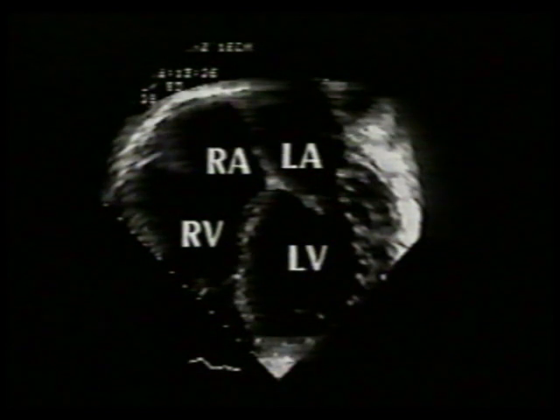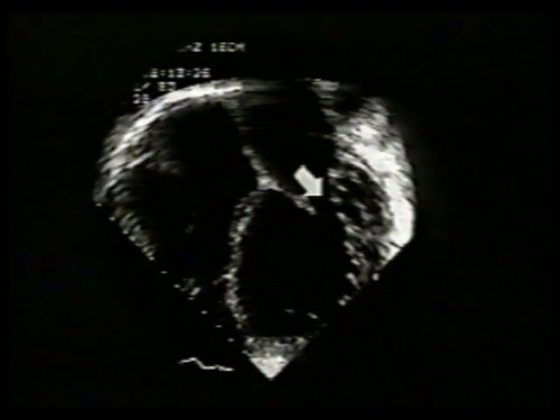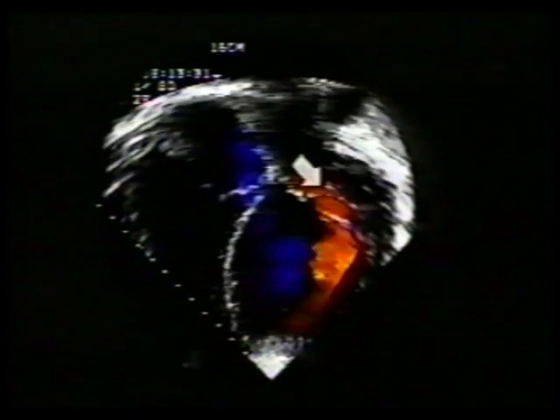We have already mentioned that with left ventricular enlargement and reduced function, the mitral apparatus becomes displaced from the septum. In this apex down orientation from a 56-year-old male with idiopathic dilated cardiomyopathy, note that the mitral orifice is oriented toward the lateral wall of the left ventricle.